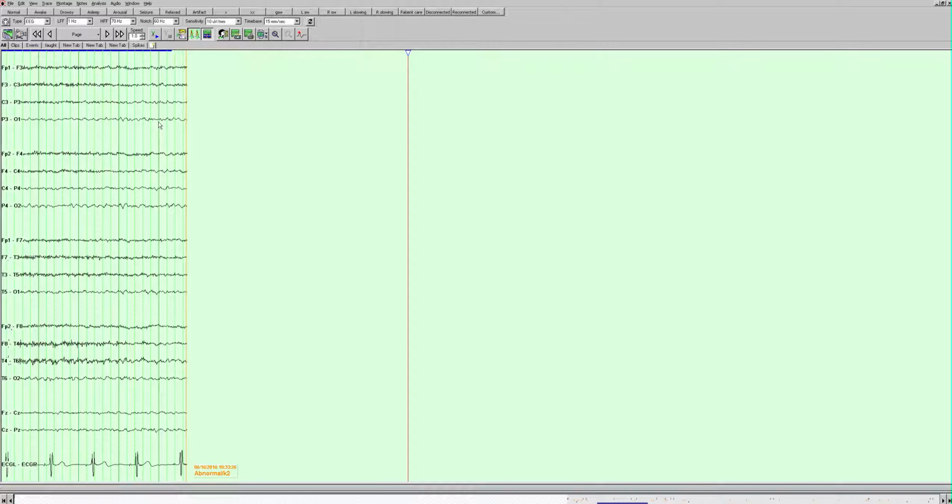And for the clinical significance, I would say these findings are consistent with either a genetic generalized epilepsy syndrome or a focal frontal lobe epilepsy with rapid bilateral synchrony, and clinical correlation is advised. The only way to really tell is to evaluate the seizure semiology, and that could help you distinguish between these 2 different epilepsy types.